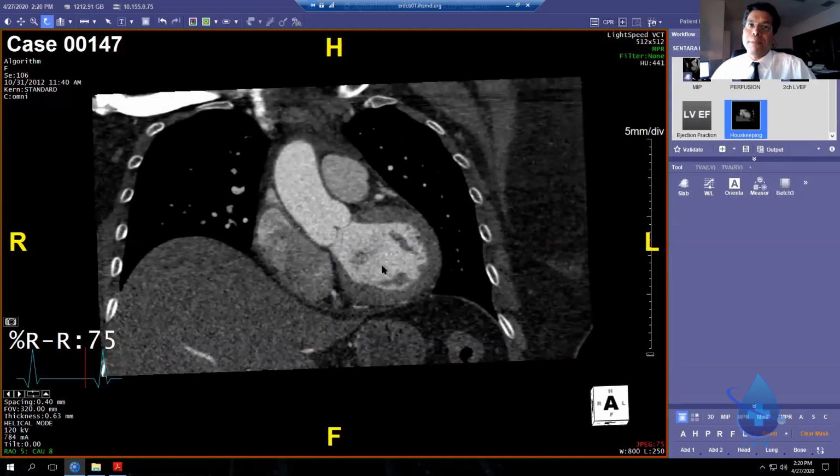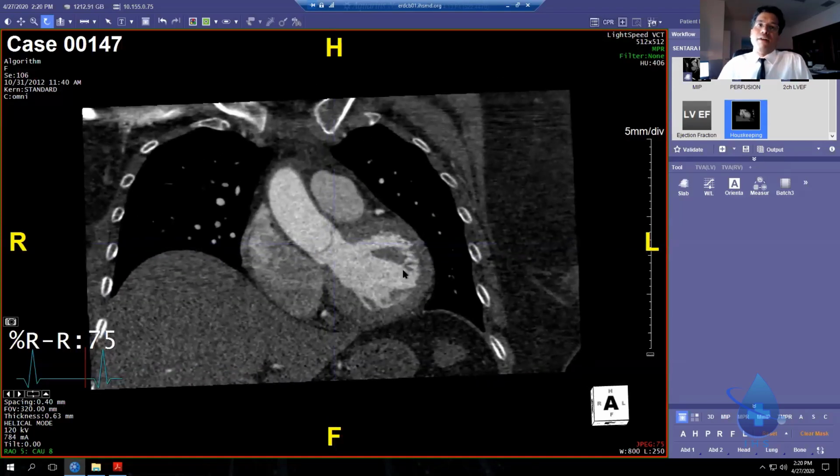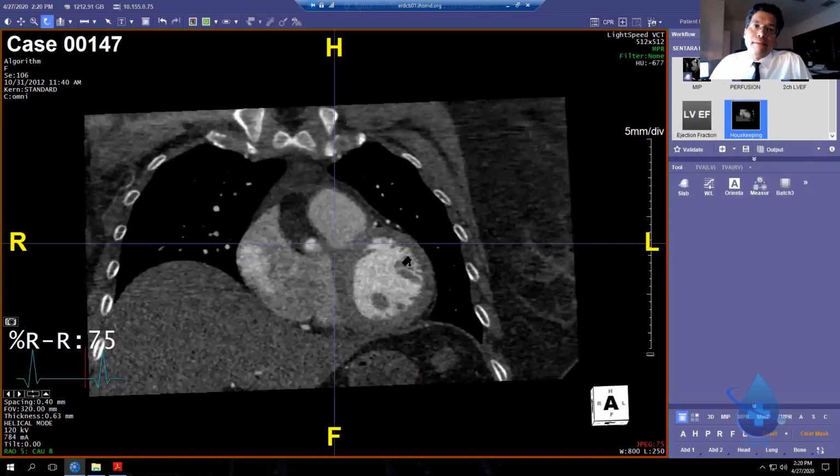And that's your 3-plane review of the aorta: AP, axial, and candy cane. I just cannot emphasize it enough. I'm going to pimp the hell out of you guys tomorrow until you get it. Now, the pulmonary arteries, let's talk about that.